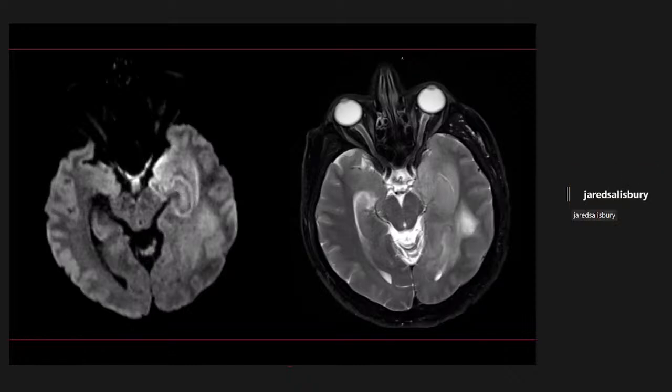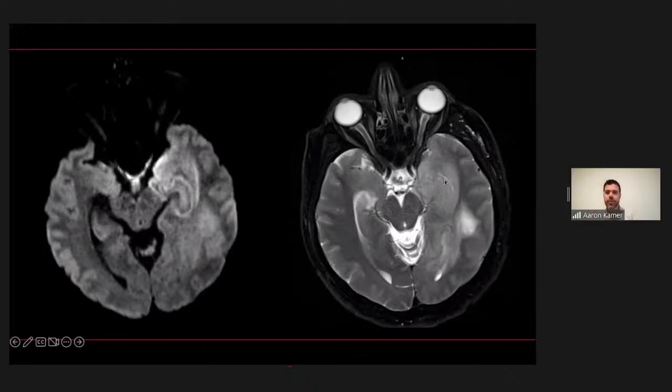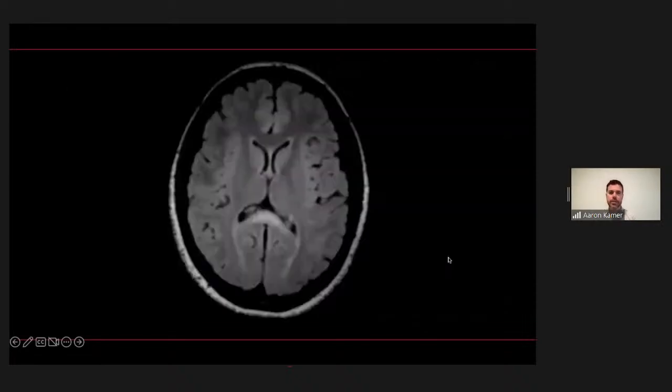Right. And then a little bit more inferior to that, I don't know if you're seeing on the T2 images, there's some increased T2 signal within, I don't know if that's the frontal parietal cortex as well, but it's asymmetric to the contralateral side. Yeah, there's a lot of T2 hyperintensity, and I love that you're noticing all this stuff, even around the occipital horn of the lateral ventricle, going into the white matter of the temporal lobe. Okay, so tell me about that.